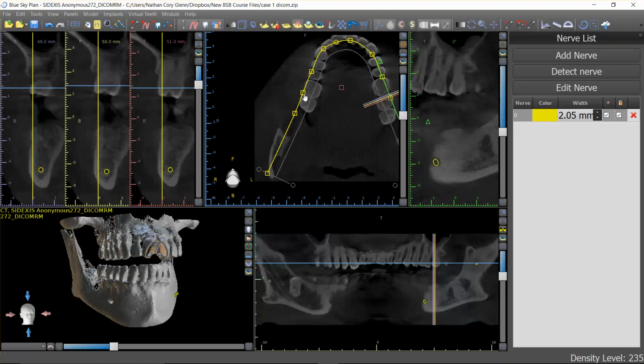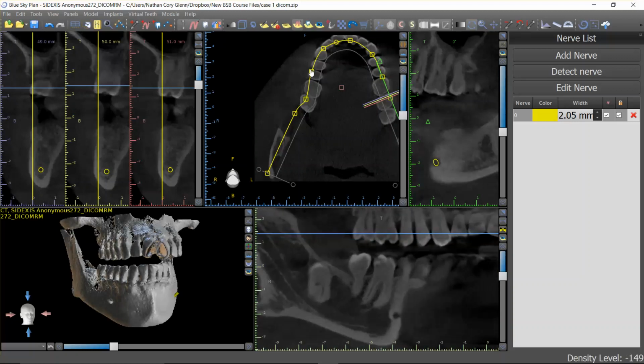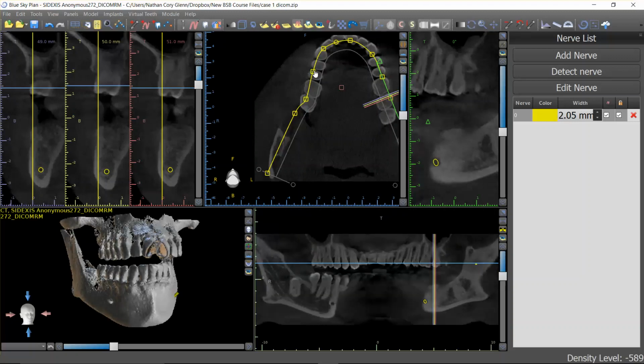All right, so this one here, here's where I'm missing clarity on this. So I'm going to move that one. Now I can see it. And sometimes they can be hard to see. And this is why oftentimes it's going to be difficult for the computer to do a nice job of rendering that. There we go. All right. So I could perhaps move this just a little bit right there.